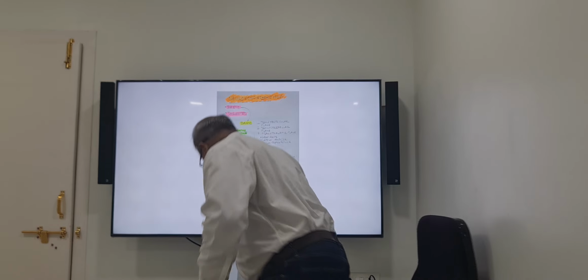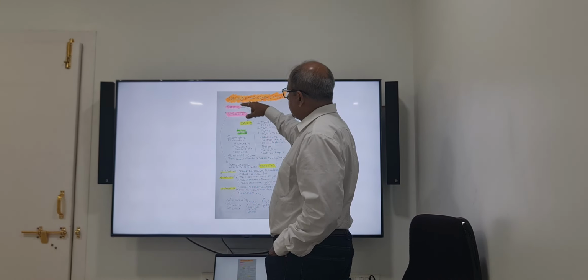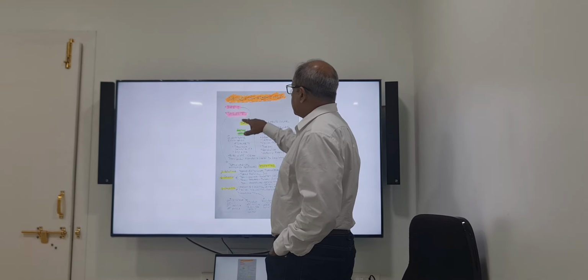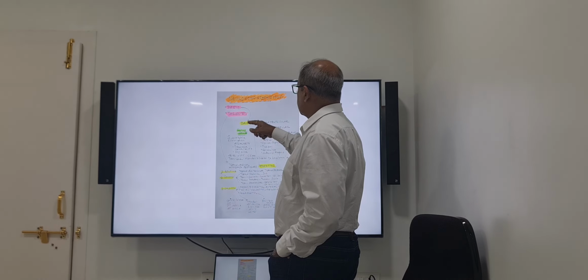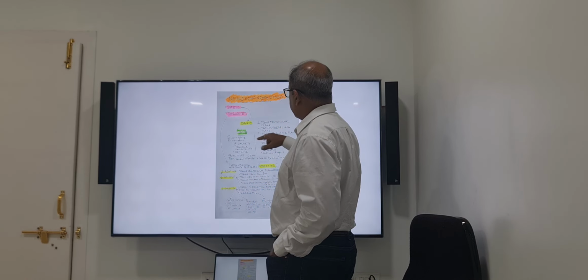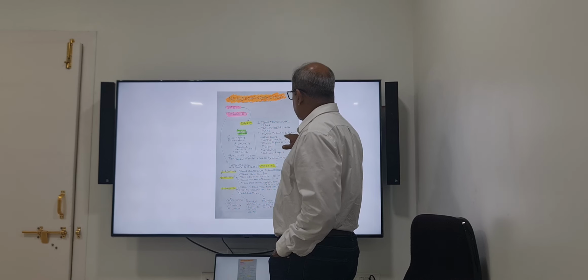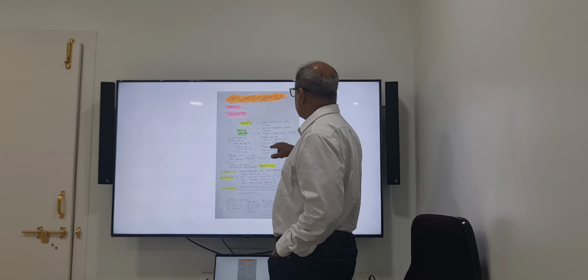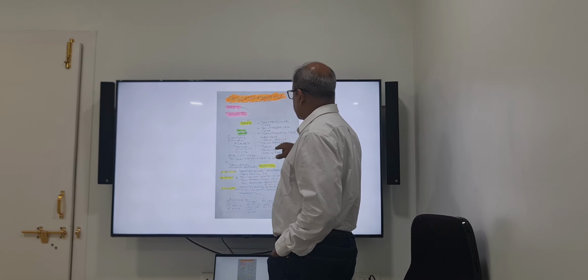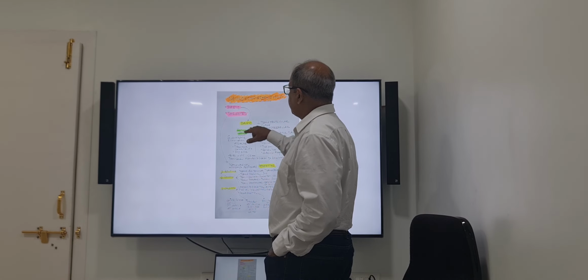This is neurosonography by ISUOG. There are two parts, one is basic, one is targeted. The basic, I will be discussing in detail. The basic contains the transventricular plane, transcerebellar plane and transthalamic plane, and with that we have to know about the head shape, lateral ventricle, cavum septum pellucidum, thalami, cerebellum, cisterna magna, and with the basic scan, do the basic fetal spine.